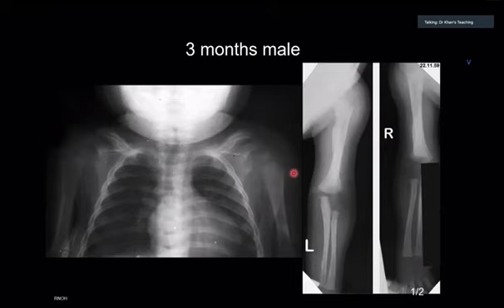But what is the pathognomonic or exam finding? The exam finding is the mandible, maybe the clavicle. And you can even ask the examiner that I want to see that, if it is not visible on the film which he has shown you.